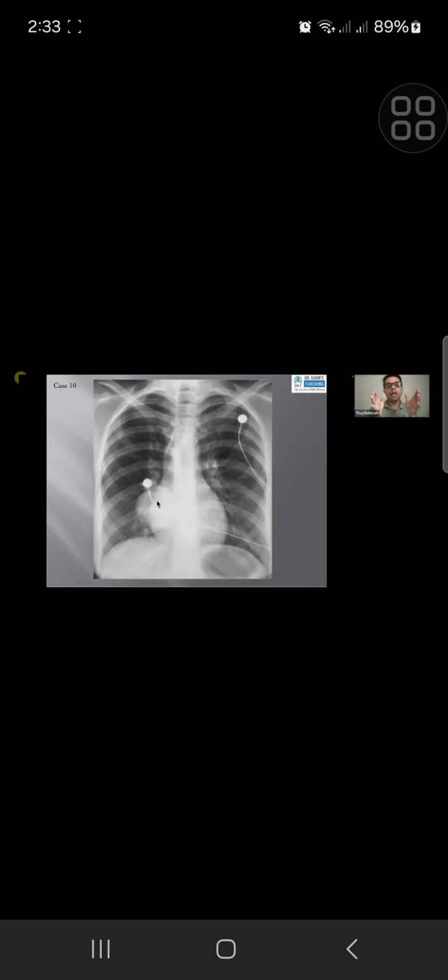It contains heart, it contains the blood vessels, it contains the pericardium covering the heart. At that level, it contains only heart. Thymus is a bit higher up here. A goiter will be somewhere here, trachea there. So we'll go into that later when we are in the mediastinum chapter.